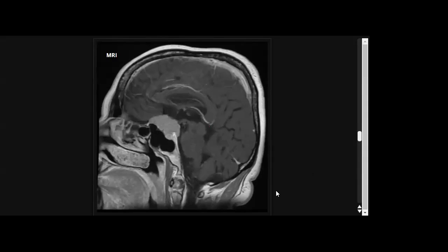So on these findings, my first diagnosis is meningioma. The possibility of this being macroadenoma appears less likely, as I can see the pituitary gland very well placed and well circumscribed within the pituitary fossa. Excellent. I will convey my dural tail findings and dural base as well.